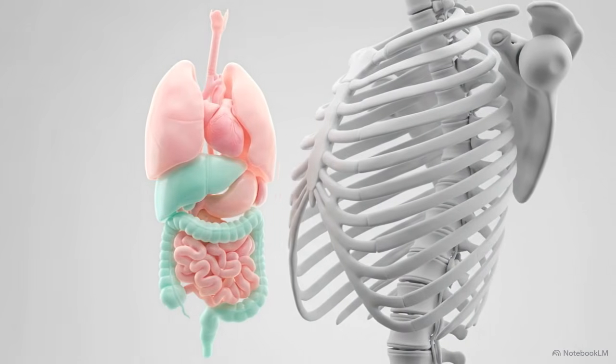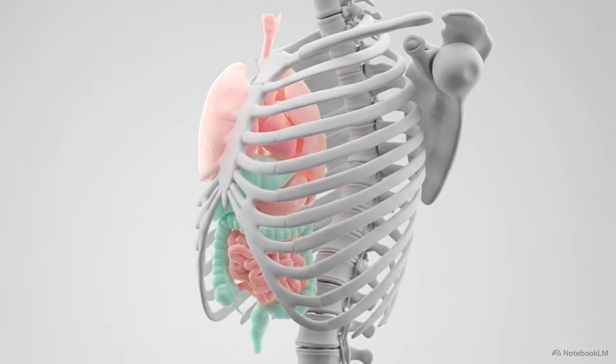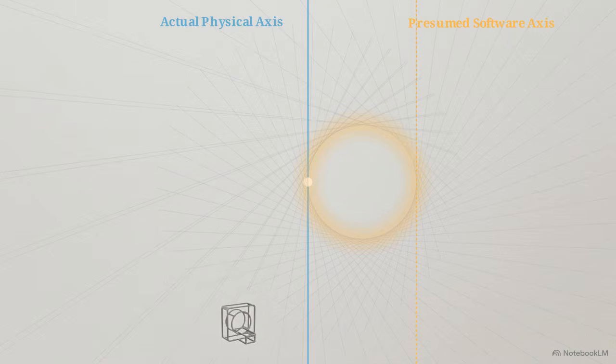Modern clinical practice rarely relies on isolated functional scans. We fuse functional SPECT or PET data with high-resolution structural CT data. Look at this 3D wireframe camera representing a SPECT acquisition sweeping around a patient. If the software's presumed central axis of rotation fails to match the actual physical axis, we get a center of rotation error. The back projection algorithms push data to the wrong spatial coordinates, smearing point sources into blurry, ring-like distortions.